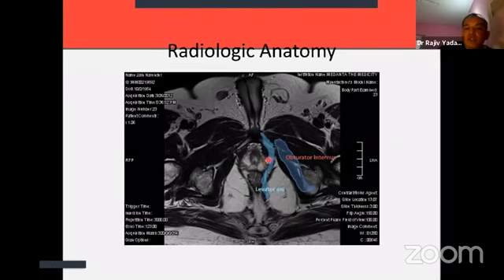But if there is a clear tumor here, showing an abnormal bulge on one side while the other side seems normal, there is a very high probability that it is invading the levator ani. It doesn't make sense to operate on those patients, because the tumor is invading the levator ani, meaning you will be leaving the tumor behind and the patient may become incontinent after surgery. So you can use this information while selecting the patient, what kind of treatment should be offered and whether surgery should be offered or not. Similarly, a big chunk of lymph nodes around the obturator internus means the disease is high risk, it has already spread, and you will obviously find other lymph nodes in the rest of the body.